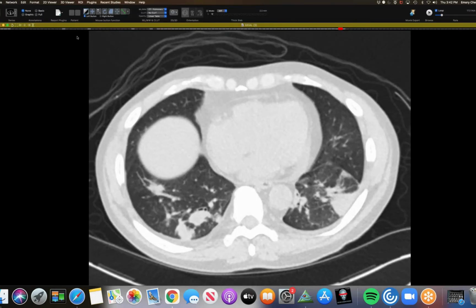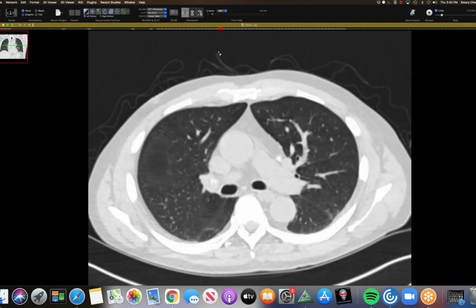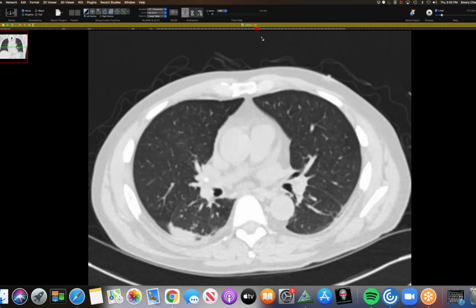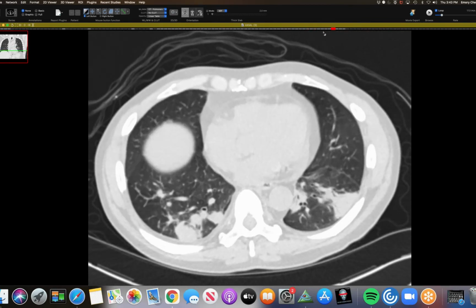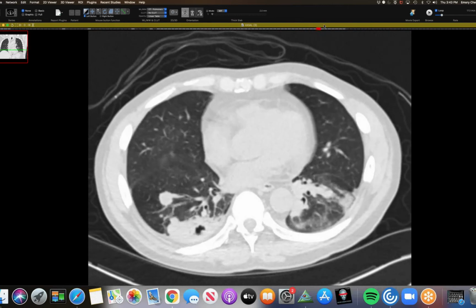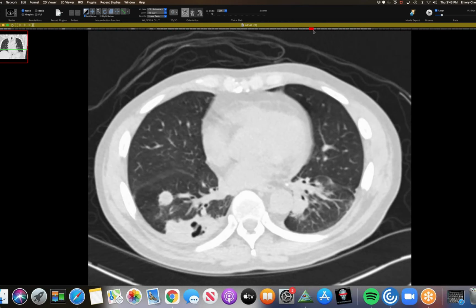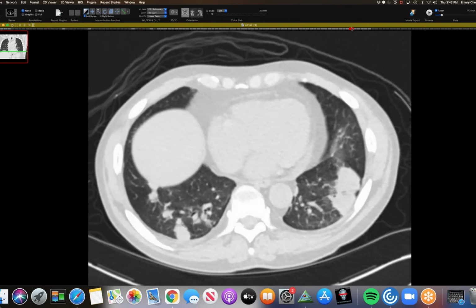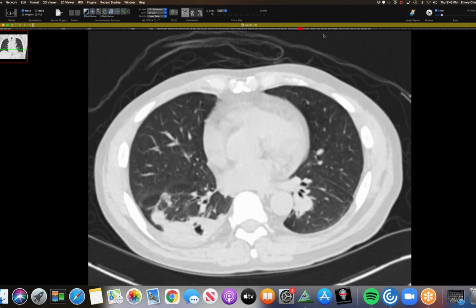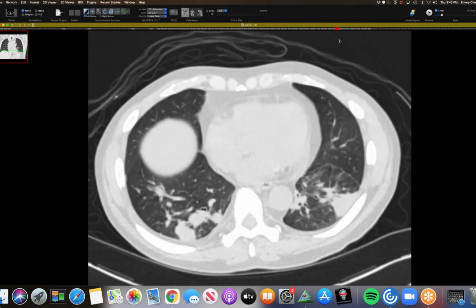Another infection. This gentleman is in his mid-60s, and he's on steroids for an inflammatory arthropathy. So he has these consolidations. Any guesses what the bug was? Let's see, we have cavitation, multifocal, rounded cavities. Oh, could be something bad. Could even be somewhat immunocompromised. Mucor even. Yeah, ugly fungus or nocardia. So it ended up being Cryptococcus.